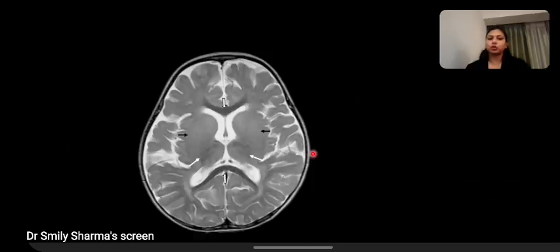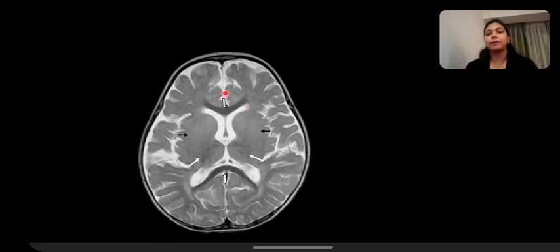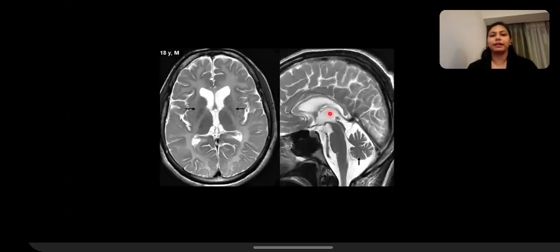Then this is a case which you should remember, this pattern you should remember. So it is a secondary hypomyelinating leukodystrophy where we have diffuse hypomyelination but hyperintense basal ganglia and preserved corpus callosum. So this is a case of, yes, very good. So infantile onset GM1, GM2 gangliosidosis.